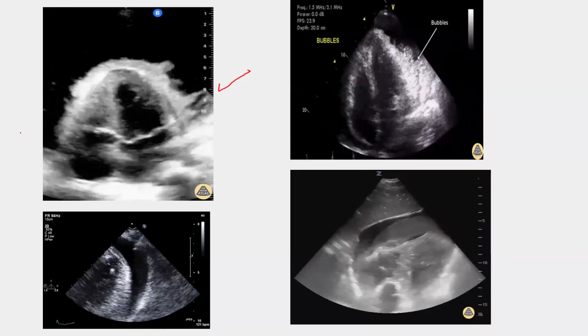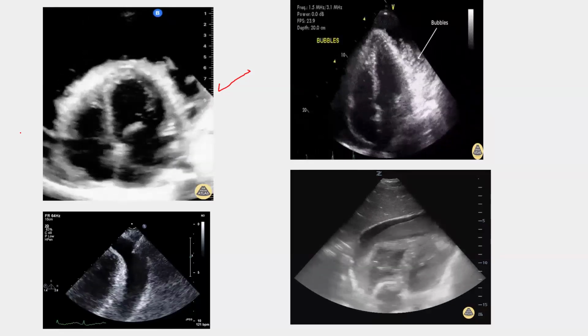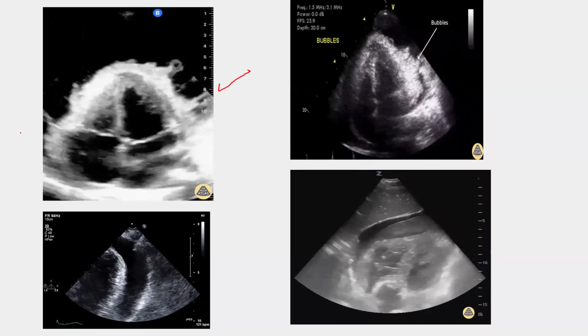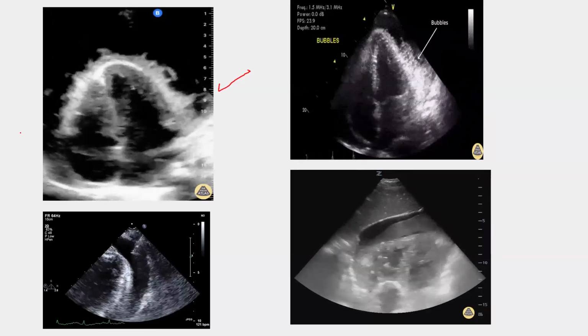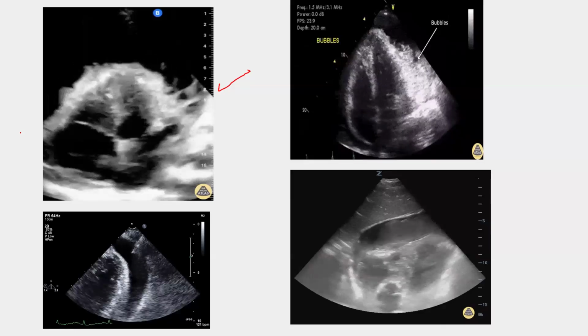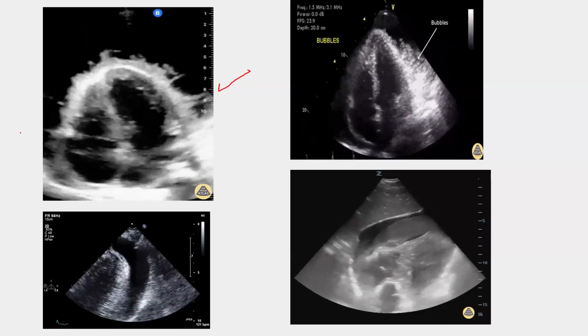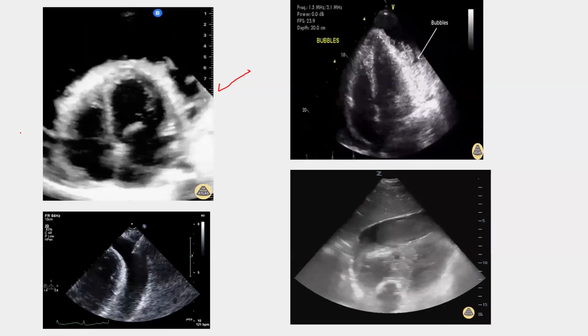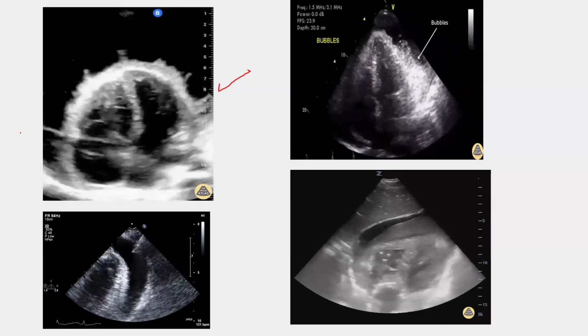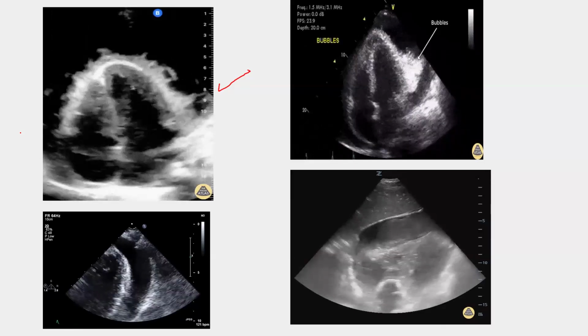Fibrous bands like this mean that the effusion is what? Is exudate, and a very dense exudate. So usually this takes place in conditions like malignancies, infections, and stuff like that. Inflammatory pericardial effusion, infectious pericardial effusion, or malignancy-related pericardial effusion.